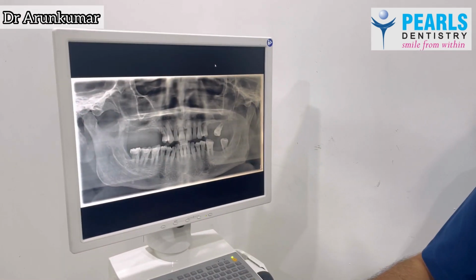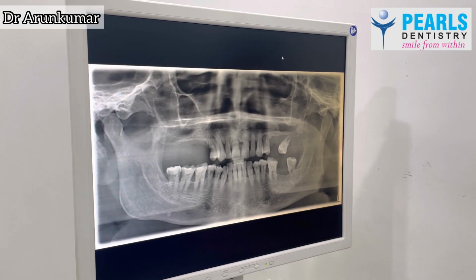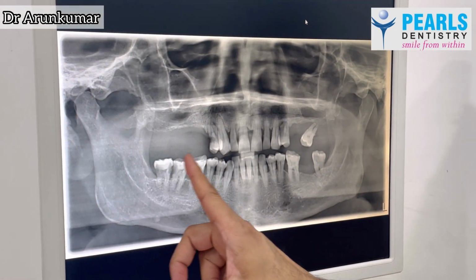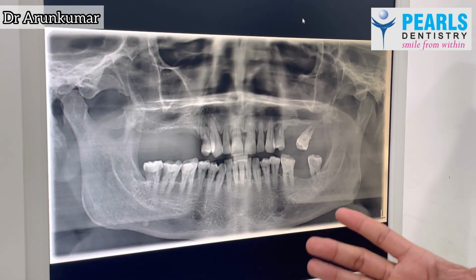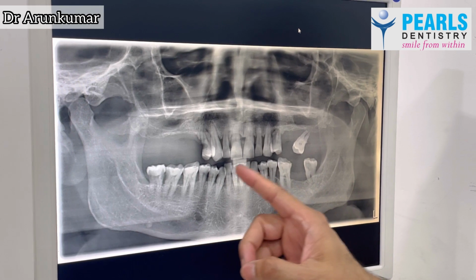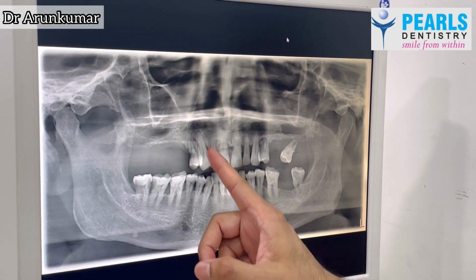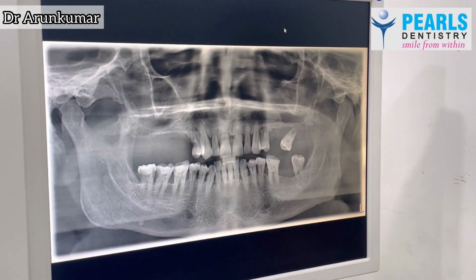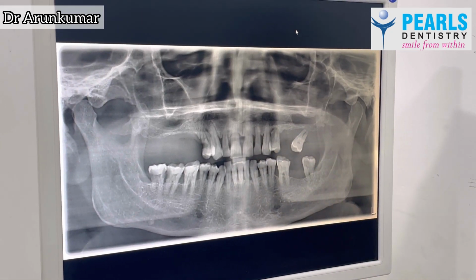So that's the X-ray that we were discussing in our previous video. We had just a brief recap. If you have not seen the video, we had a patient coming in and asking for replacement of just a few teeth in the posterior region. But when we looked at the X-ray, we had a complete loss of bone on most of his upper teeth. It's only 20-30% of bone left. So it was decided that it's better that we plan for a full upper arch reconstruction.